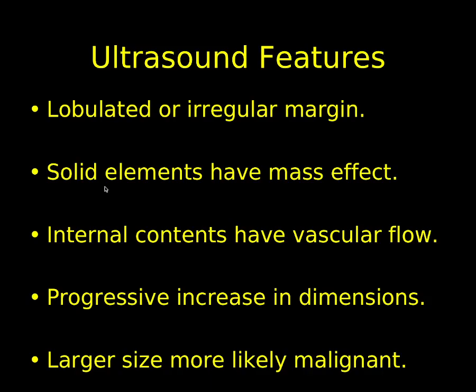So this is probably our most important slide. I think we discussed in the physiological cysts video some of the classic features of those physiological cysts, such as the peripheral flow and the smooth borders. These are the signs which you want to really note down and be looking for all the time in order to identify a malignant ovarian tumour.